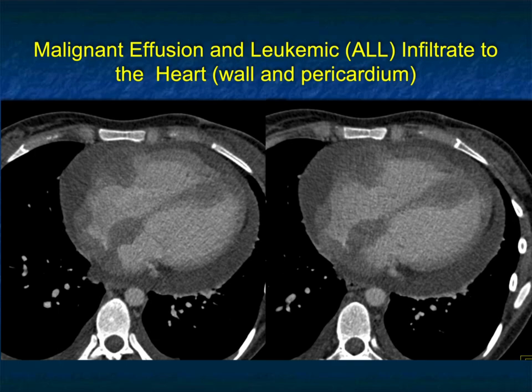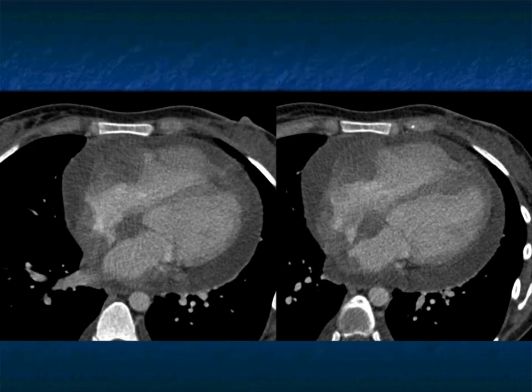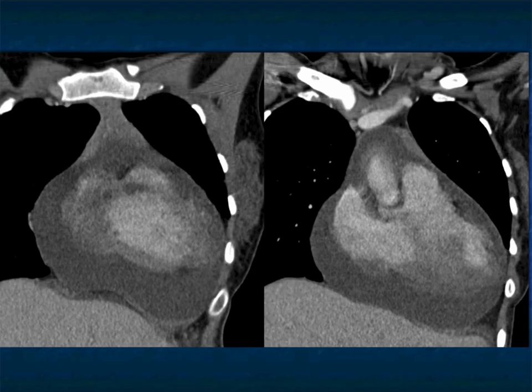And so when you have malignancy, sometimes you see the lobulations in the fluid or the pericardium or in adjacent chambers. And that's why you know you're not dealing only with a pericardial effusion, but you're dealing in a patient with tumor as well.